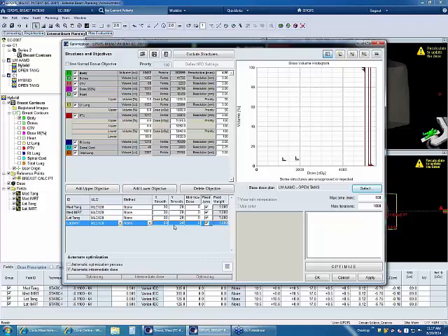I am not going to use the NTO. There is not enough normal tissue that I want to spare, quote unquote, because it's a tangent. We want to treat all that breast tissue, and there isn't really anything normal. The field edge to the chest wall itself is only 1.8 centimeters, so that's about 8% of the lung volume. I don't need to do that. I can use my constraints. The normal tissue really isn't an issue with this, so I am not going to use it. I'm just going to leave it alone.